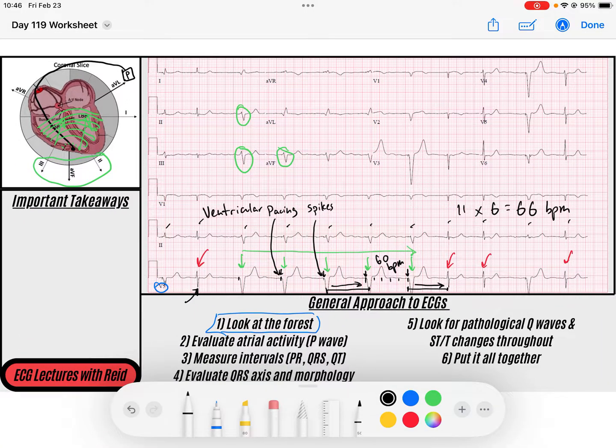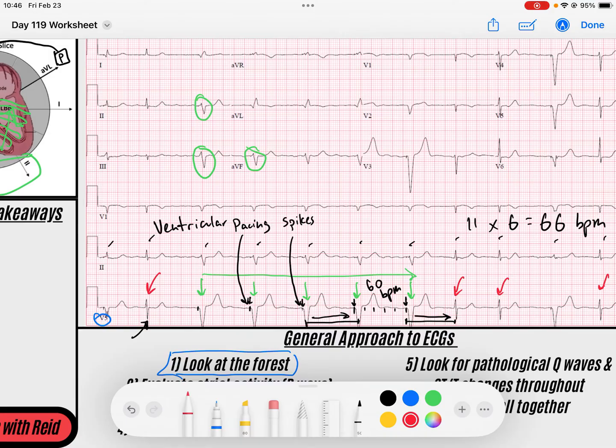So I'm like, well, I wonder if the atria is driving this rhythm. So I look for atrial activity. I look for it before the QRSs that are narrow, because I know narrow QRSs means that these were conducted via the AV node, right? And so I don't see any really great atrial activity. And so what's actually going on, you can see it best in lead 2. You can see there's this baseline kind of small fibrillatory type pattern.